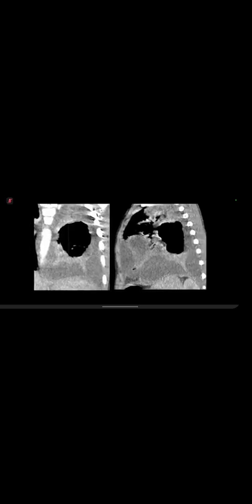I think when you zoom in, we lose your pointer. Do you mind zooming out a little bit, and then we can see your pointer to see the different areas? So here is the normal enhancing, which you can correlate with a sort of tongue shape, and you can see this enhancement. But here is the anterior bit. If I zoom it now, the anterior bit doesn't enhance as well as you would see in a normal lung collapse. Thank you very much.